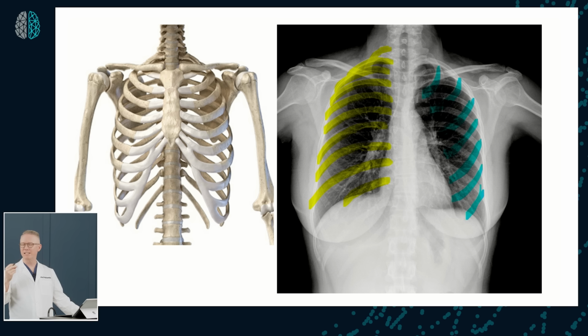They're also less prominent on an anterior posterior chest x-ray due to overlapping soft tissue, but also the distance to the detector plate receiving the x-ray beams, right? Now, on a PA, a posterior anterior, where the detector plate is on the anterior portion of our chest, they can actually appear clear. Okay, and that's one way sometimes you can identify an AP versus a PA, especially if you have something to compare it with, because they're closer to the plate. Now, obviously, that is influenced by soft tissue that's present there, okay?